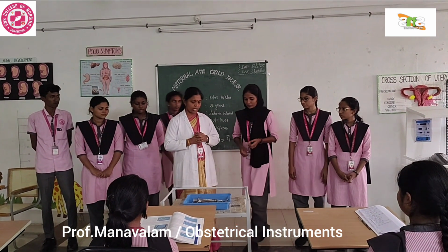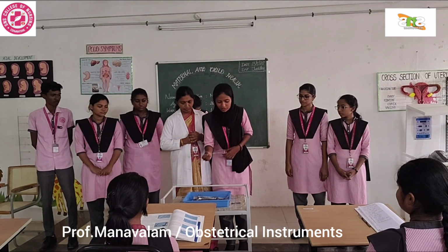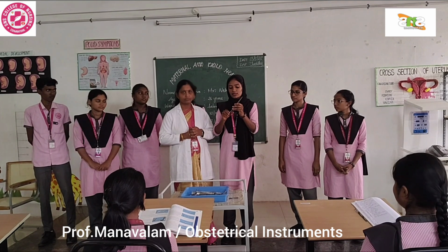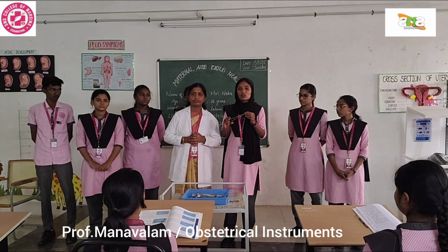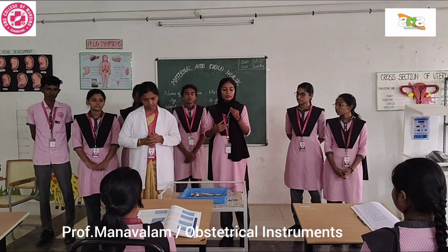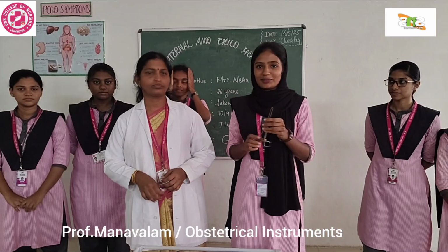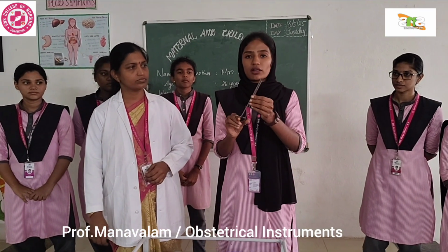You choose one instrument and explain about it. This is Allis tissue forceps.